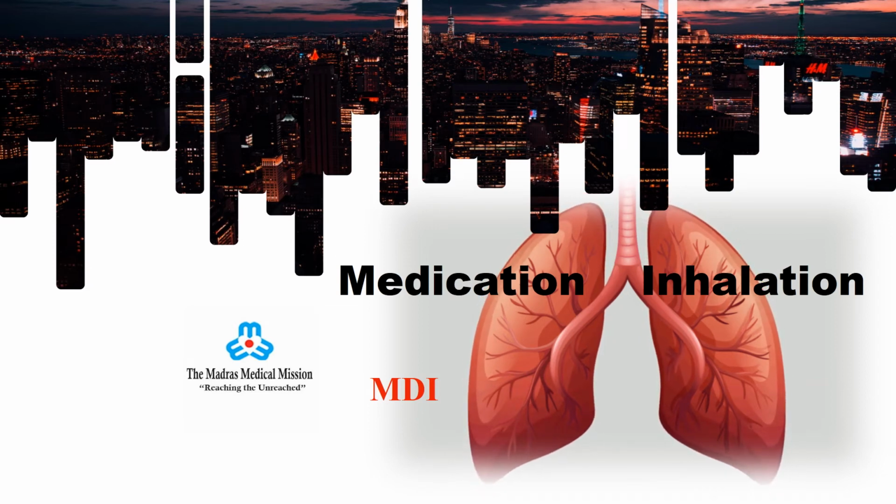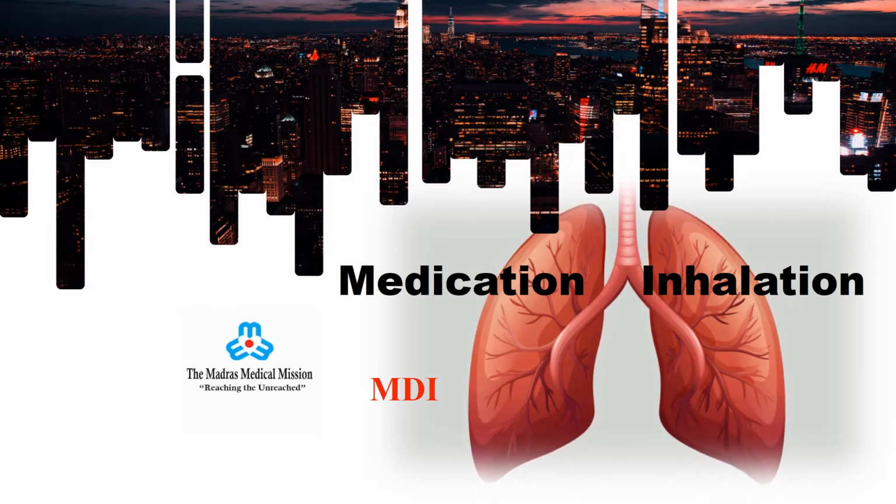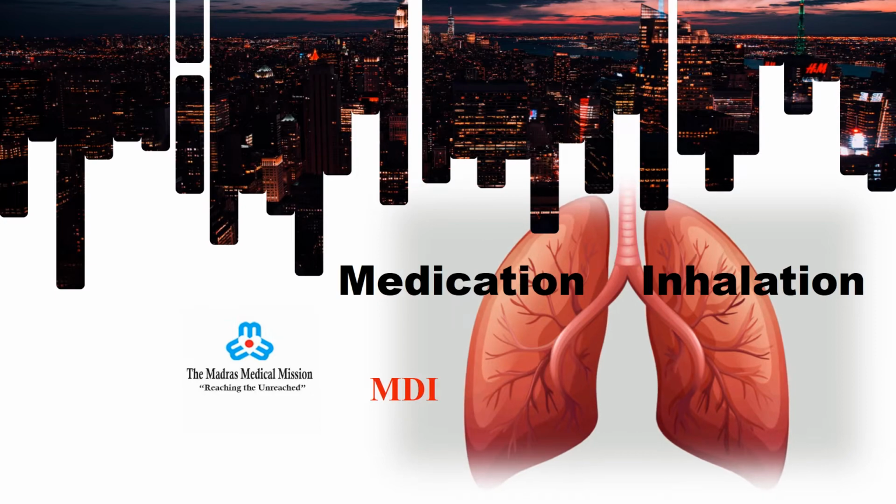Hi everyone. In this video we are going to learn about the metered dose inhaler, which is one of the methods of medication administration through inhalation.